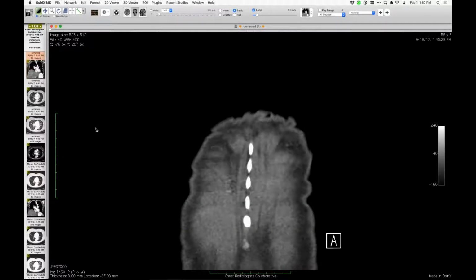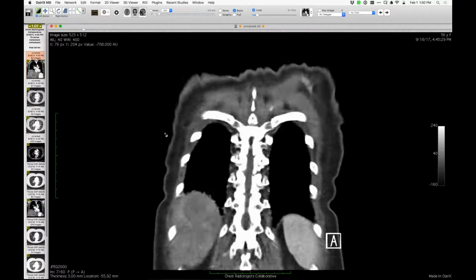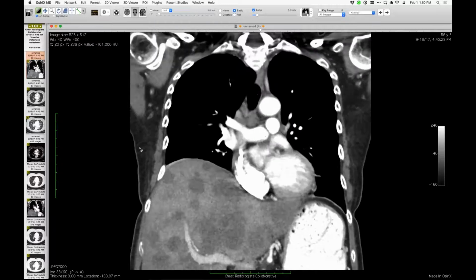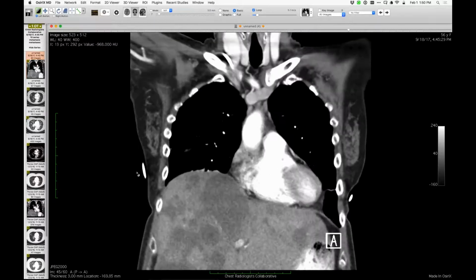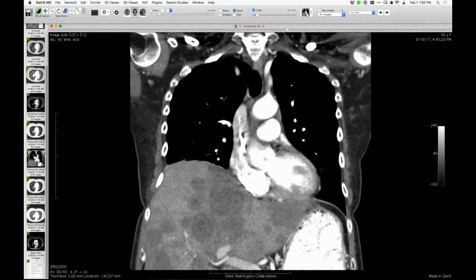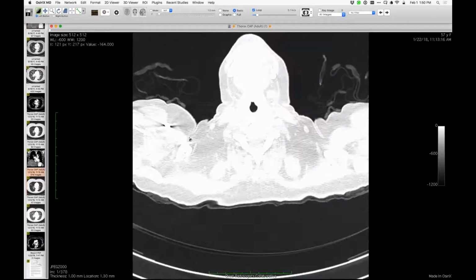This is the kind of case that we've shown before, but it's another example of it, so I thought worthwhile to show again. So the context here is an unfortunate patient with rather extensive metastatic disease from a colon cancer, extensive involvement of the liver, as you see there. And then let me bring up some thin cuts for you, which will be these. And then I'll do some MIPS.